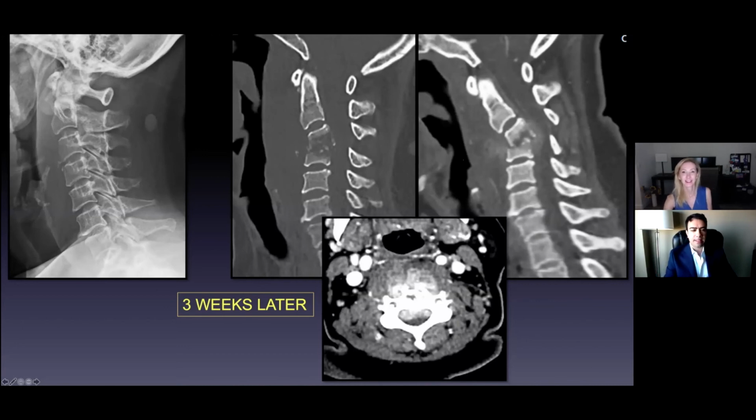Now, the next thing is looking at the patient's alignment. Look at the CAT scans compared to the patient's X-ray. Although the X-ray was a little bit abnormal, look at the alignment. Remember in last week's sessions, I talked about contour lines. There were 4 of them: anterior, posterior, spinal laminar, and the spinous process contour lines. If you draw straight lines down the fronts and backs of the vertebral bodies, behind the lamina and the spinous processes, you want to see a smooth, gradual transition between each one of those. On the X-ray, it looks pretty good, honestly.